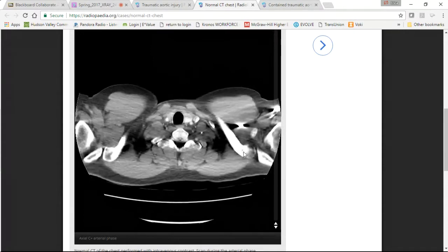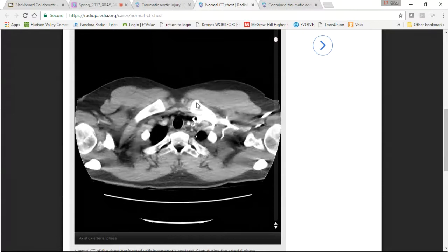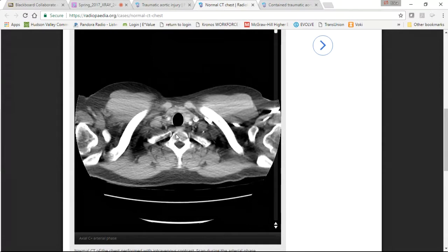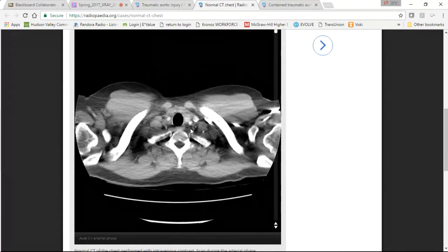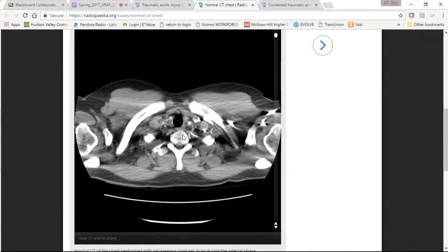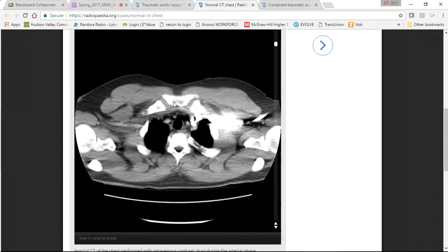You have to do a couple of slices up and down to start to orient yourself. It's very easy to confuse this with the medial anterior border of the first rib, and it's not. This is the first rib articulation. Follow it back, back, back, back. There's your first rib on T1. So that's your thoracic inlet. It's an opening like a circle that's on an angle down, because we're seeing the superior posterior portion of the thoracic inlet here, and then it travels around and articulates with the manubrium.